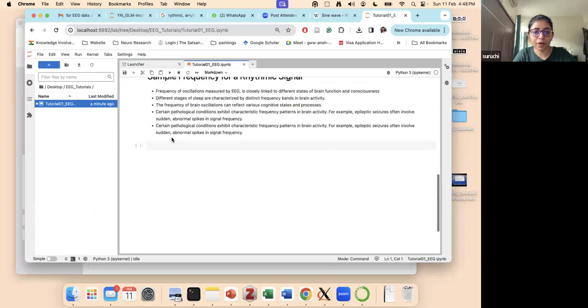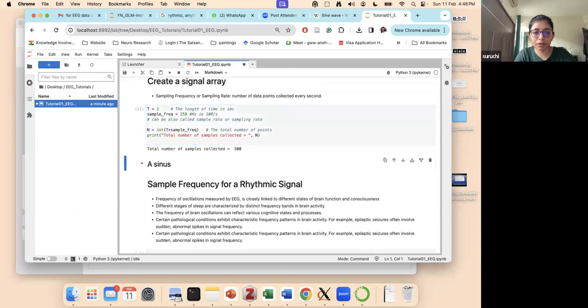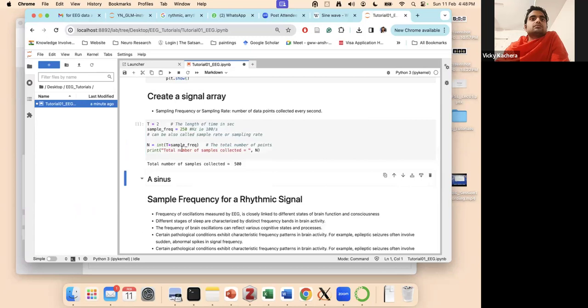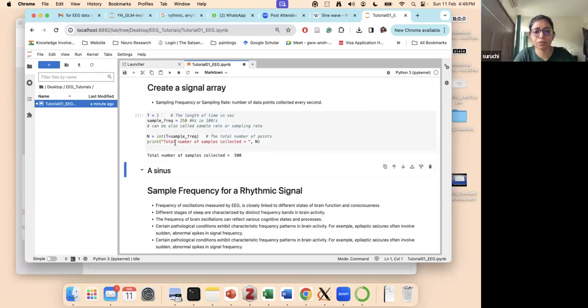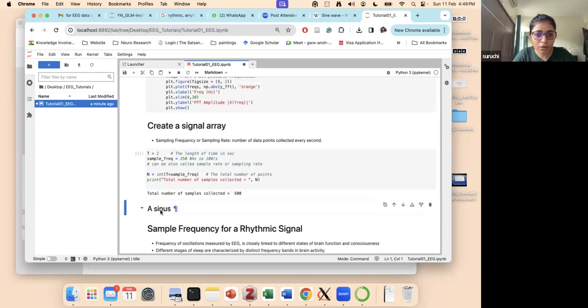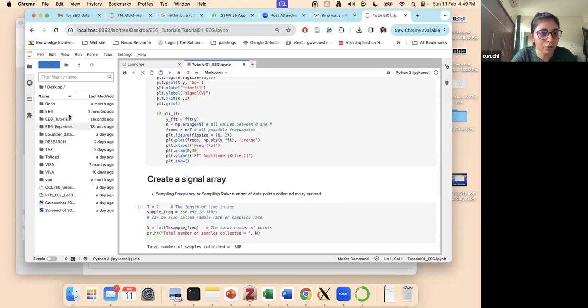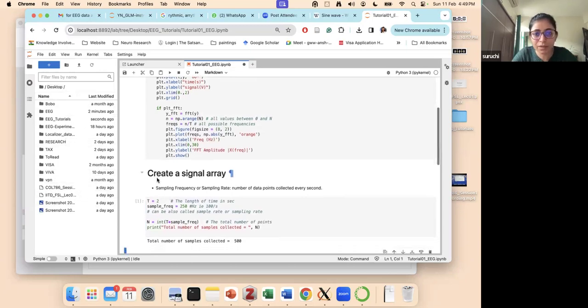And now if I just run this, it will give me an error. Okay. No, this is good. There's no library that I'm using, and the whole thing didn't get saved. So interesting. So I'll send you a revised one. Before saving, I probably sent you this. But anyways, you can download this.